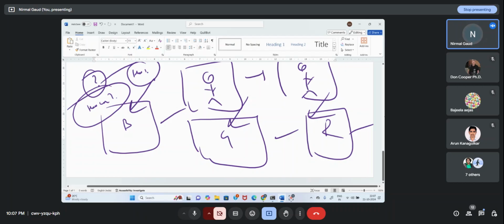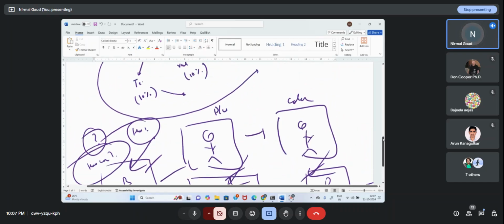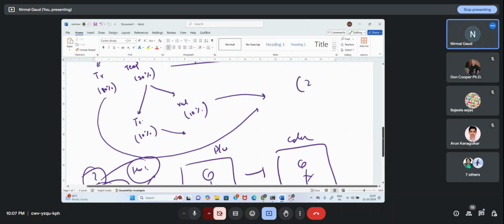Every transformation, every selection which you do, every kind of operation which you perform, that brings a change. These three, blue, green, these are the channels. So I selected three channels now as my color mode. And I gave the image, now I changed 224, comma 3.